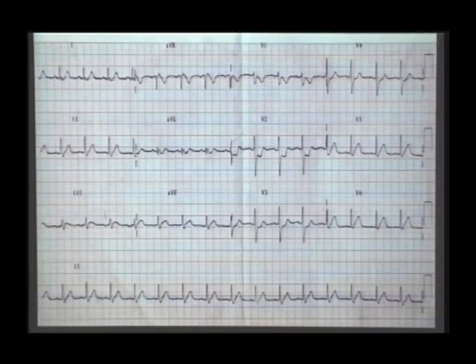So just compare the segments, you can compare it nicely here. You see that ST here, V3, you see that ST here. So that is the earliest sign of the very early hyperacute phase of subepicardial injury, a slope elevation of ST segment. So that's why I told you, for chronic old inferior wall infarctions, I asked you to look at V1 to diagnose a tall R wave for posterior wall infarction.